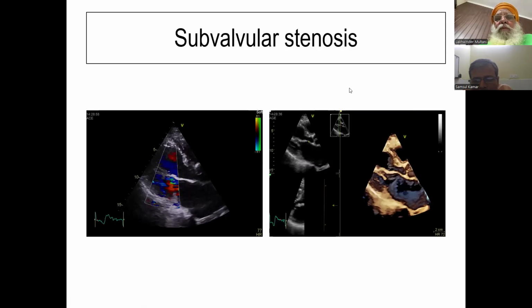In case of mitral valve planimetry, we took the measurement in mid-diastole. In case of cusp separation, should we take it in mid-diastole or the highest diameter? Highest opening. Sir, in planimetry. Say it again, then repeat your question. Sir, in case of planimetry, we took the area measurement in mid-diastole. In case of cusp separation measurement, should we take this in mid-diastole or the highest diameter? Both the things, whether it is mitral area or cusp separation, we look at the maximum opening.